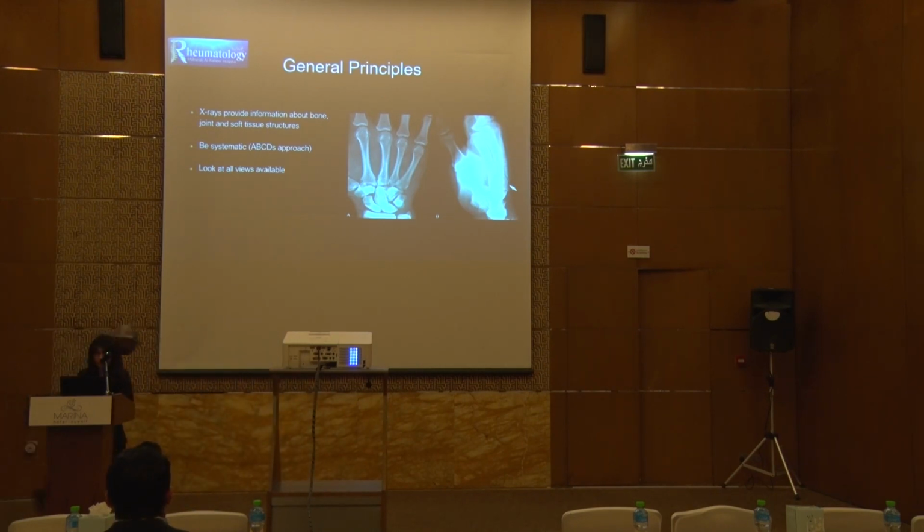You know where the arrow is pointing, there is like a thin black line. So this is a fracture, which was obvious only on the lateral plane; it wasn't obvious on the AP.